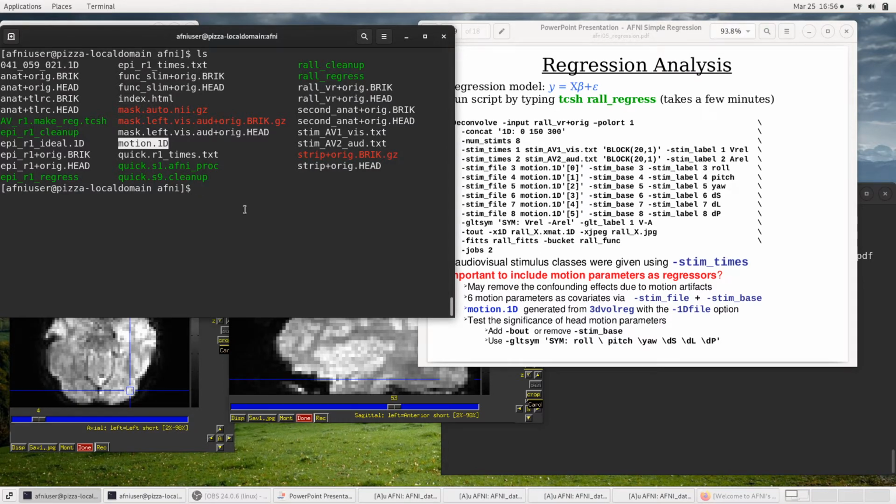This will be referenced from the registration class, but at each time point, remember 3dvolreg does 6 parameter affine registration that includes 3 shifts and 3 rotations to align each volume to a base volume. And our base volume was index 2.